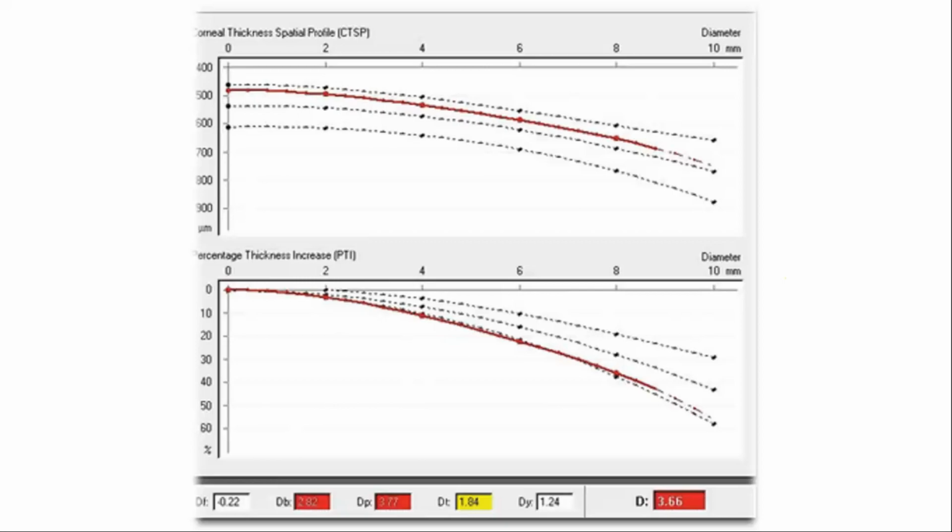And all these 5 differential parameters are summed up and compared to linear regression analysis, and the value is generated out of all the parameters. These are again color coded. If the color is shown as white, then it indicates that the standard deviation is less than 1.6. If it's more than 1.6, it's indicated in yellow, and if it's more than 2.6, it's indicated in red.